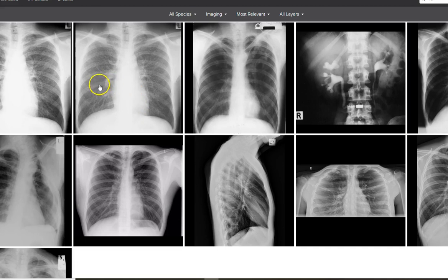So TB presents as these dots, and the reason why that's a contraindication or theoretical contraindication to treatment is that potentially they think that the spots that remain on the lungs can be cyst forming, like they form a little cyst with all the bugs inside them, and then if we used aggressive manual techniques or things like flutter, then potentially we could rupture one of those.